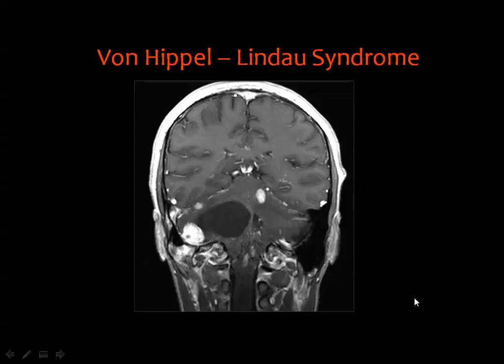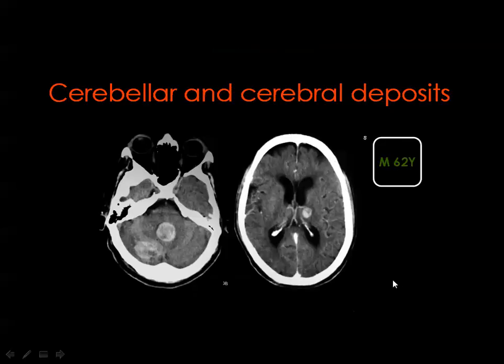And you remember that the pilocytic astrocytoma does not occur in multiplicity, while the hemangioblastoma may be multiple. And one of the important issues is that sometimes you cannot appreciate the cystic component of the lesion because the mural nodule is almost occupying the whole cystic space.